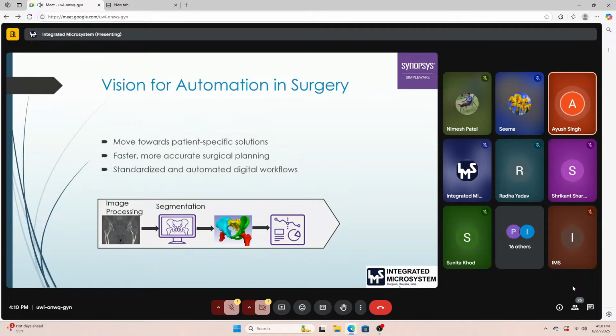Now moving on to the segmentation part. In the segmentation, the general workflow that we offer is to do automated segmentation using Simpleware. And even if your data doesn't get fully automatically segmented, we are supported with semi-automated segmentation too. While generating an automated segmentation, we get a perspective about the different areas in the anatomy, and if some features are missing, that might get covered using automated segmentation.